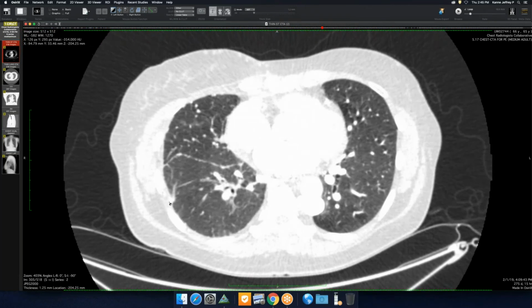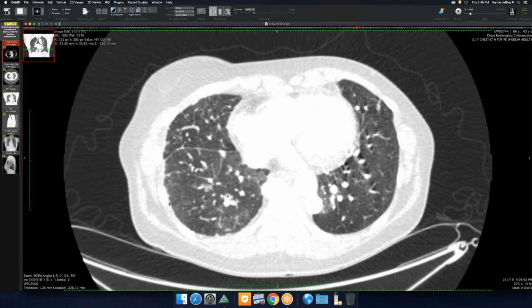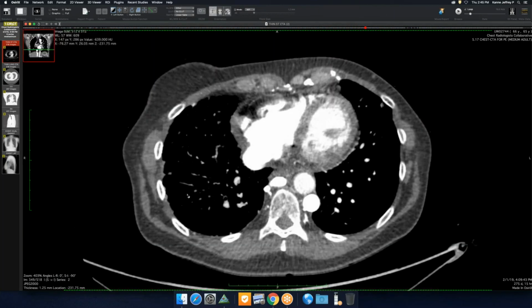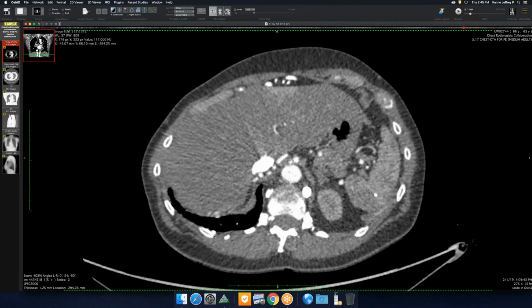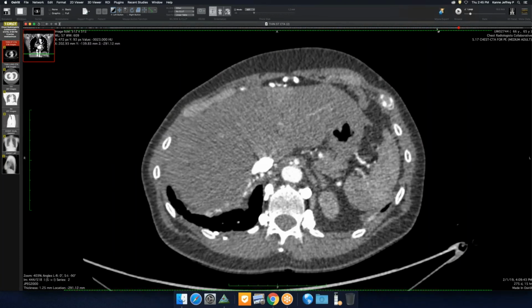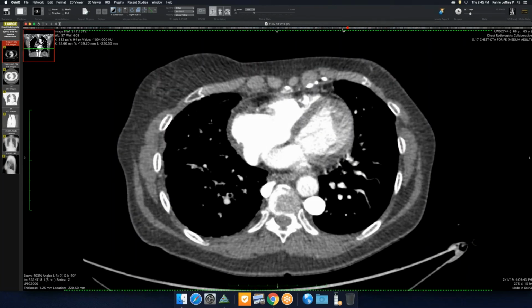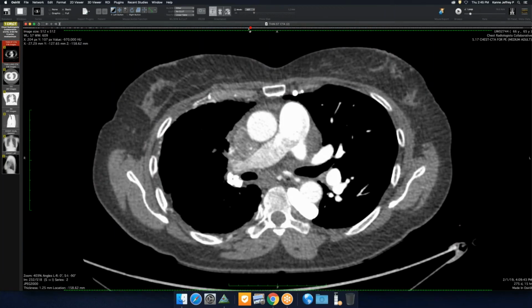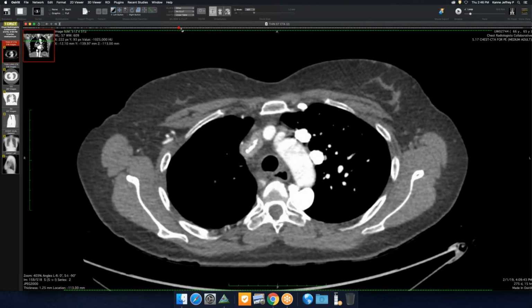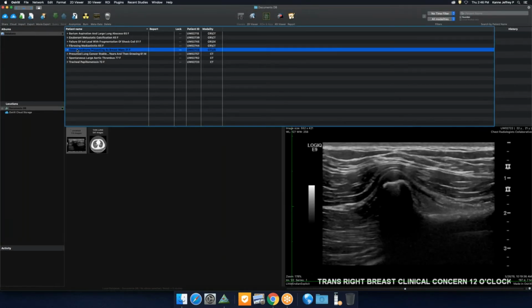Oh yeah, there was one image adjacent to a posterior arch of a rib where the intercostals were lots of vessels. If you change the window, there was one particular area, a little bit higher. If you scroll higher even, there was some really dramatic, like there and about that. That was spinal. The more you look, the more you'll find. And then up top, all of these tortuous vessels. So this develops over many, many years and tends to slowly progress. So this was kind of a cool case.